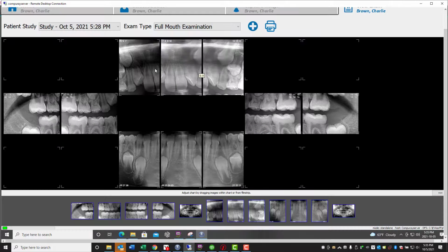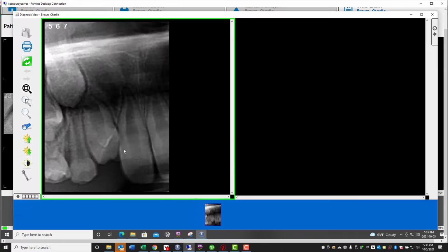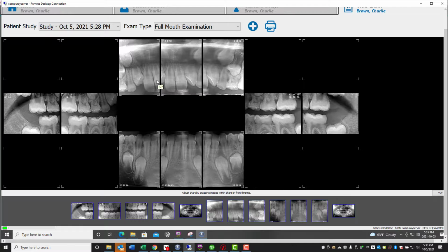And that's it. So you have the 10 intraoral images. You've gotten them all from a single scan, and you have dosed the patient quite a bit less than you would have had you captured these intraorals in a traditional fashion. A traditional pano is going to be about 10 to 15 microsieverts. Had these been captured the traditional way, the patient would have received on the order of about 80 microsieverts. So a lot less dose and a lot less scanning time for the patient.